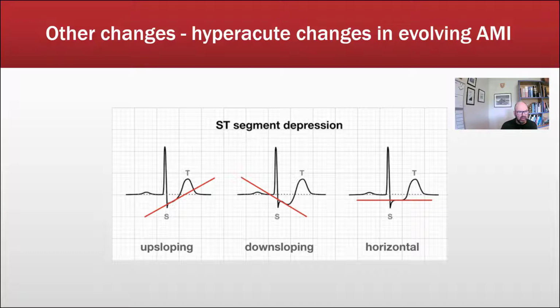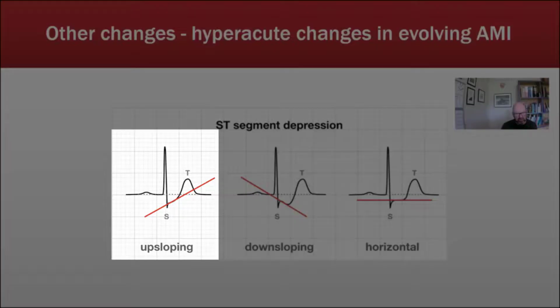The provisional diagnosis for ST segment depression is broad, and it can be caused by ventricular enlargement, pulmonary hypertension, some drugs that will do it, or there may be mechanical strain in the heart, say in the setting of heart failure. Now, these examples are more likely to produce an asymmetrical form of ST segment depression that slopes upwards towards the T wave, as can be seen on the left here.